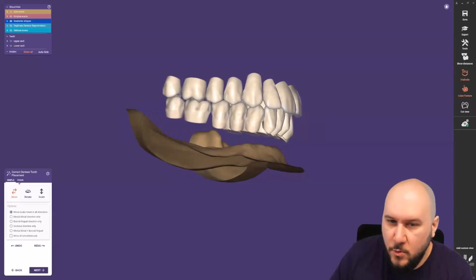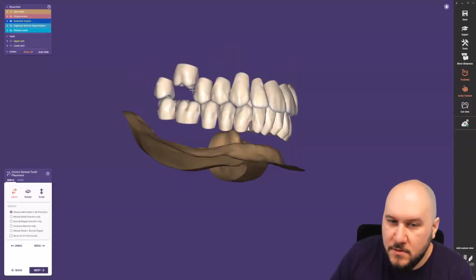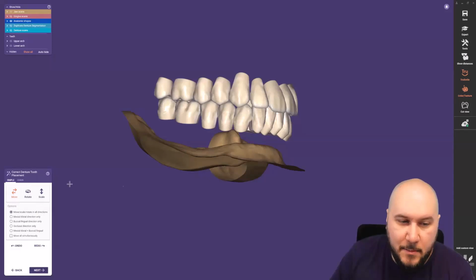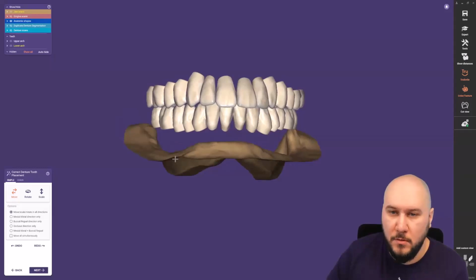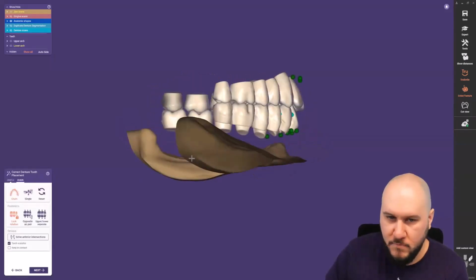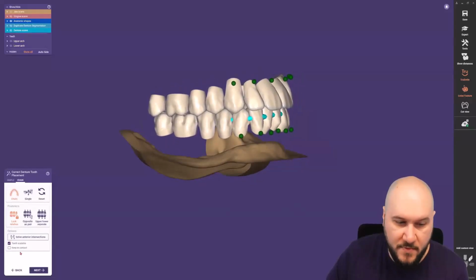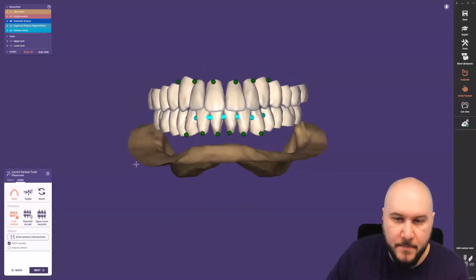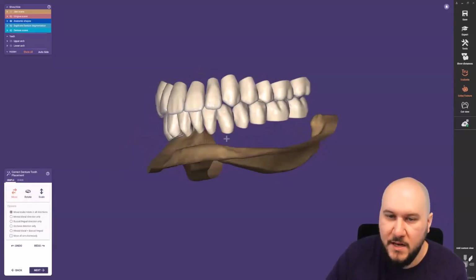What you can now do right away here for yourself, you can see the gingiva segmentation also, but right away you can also move the teeth. This is normally like the things that we have set up in the DentalCAD. So everyone who is familiar with the DentalCAD normal denture placement workflow can just work around with that. We can use tooth libraries, and we can use the chain mode or something else in this way. But I will reset all of them, global reset, to set them back on position. So different kinds of modules or movements that we can do right away here.